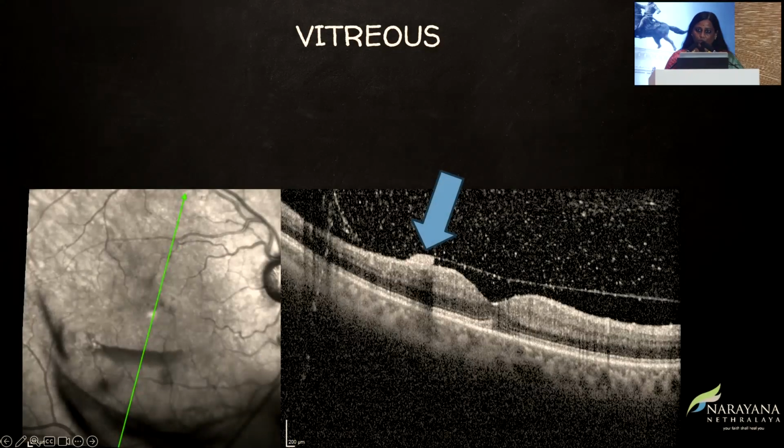So I'll go similarly, and also with a mix of a few common conditions that are seen. Typically in the vitreous, you may see some early bleeds. This is obviously a frank bleed. There is a subhyaloid hemorrhage which can be seen right there. But sometimes even posterior vitreous cells, which are very subtle, or a very, very mild bleed can be seen on an OCT at the vitreous interface.